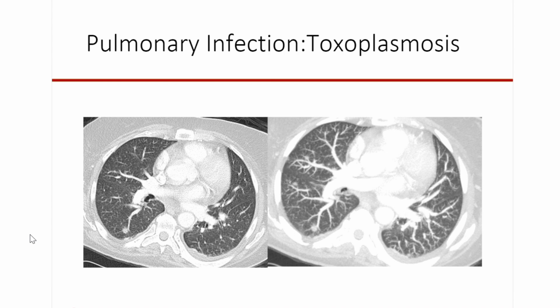What about this? All right? So this patient, in case you're curious, we did not do a head CT first. He did not present with seizures. This patient presented with fever and had peribronchovascular nodules. And of course, we said, oh, atypical organisms, consider fungus, consider such and such. And then I think in-house, he did have a seizure. And then they saw the calcified lesions, and this was toxoplasmosis.